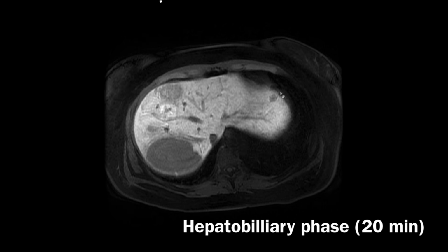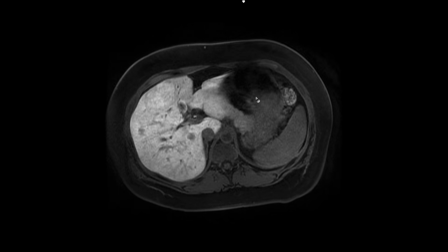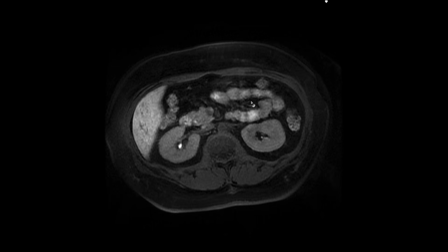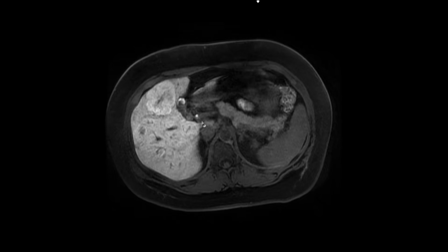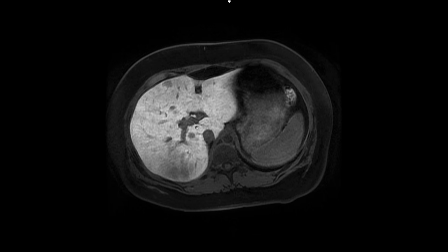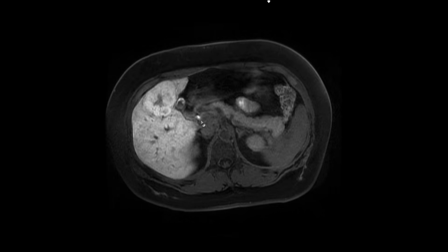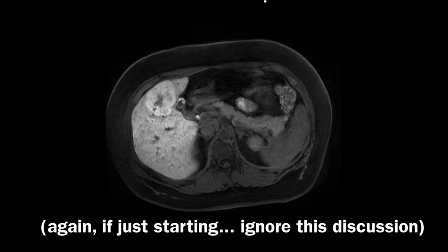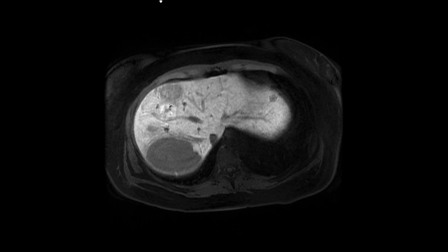So we look at these lesions on a 20-minute EOVIST scan or hepatobiliary phase, and you'll see that there is contrast in the biliary system because EOVIST or these hepatobiliary agents are excreted in the biliary systems. You'll also notice that some of these lesions, namely this lesion down here that was quite isointense, had a central T2 hyperintense scar, takes up EOVIST quite avidly, as well as this one up here.